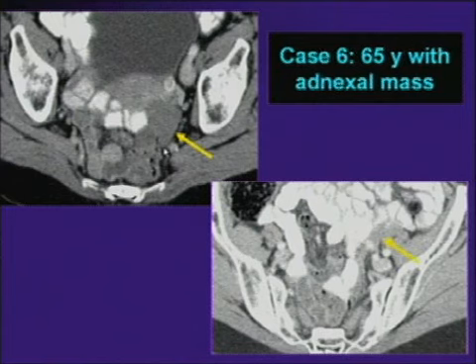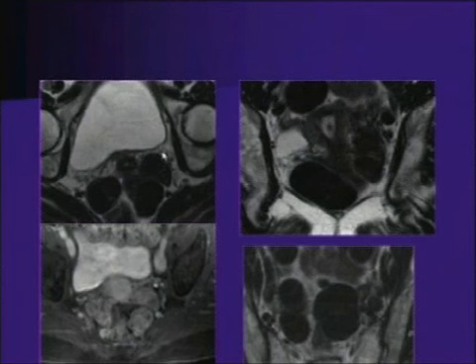We chose to go to MR in this case to try and distinguish between a collection or some kind of fibroid or degenerating fibroid. And what was interesting in this case, we see the polyp here in the endometrial cavity that we noted on the ultrasound. And we also see, here's bowel here. It can be confusing, bowel and hypointense masses, but you can see bowel here and the mass projecting off and attached to the lower uterine segment and upper portion of the cervix.